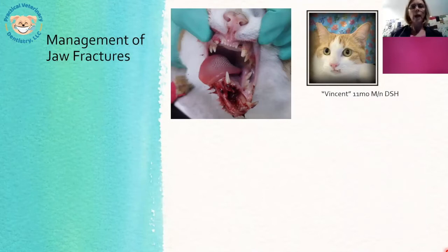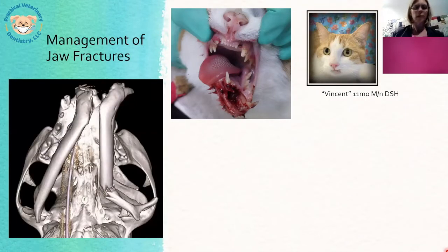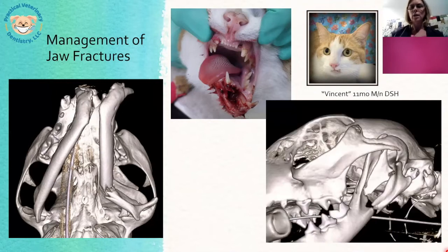And I have my cone beam CT, so I use it. I actually have access to both, but I use the cone beam CT for this. I'm able to get really nice imaging of his mandibular fracture, his symphyseal separation, and back in the back here, we can see that he's got quite a few mandibular fractures.